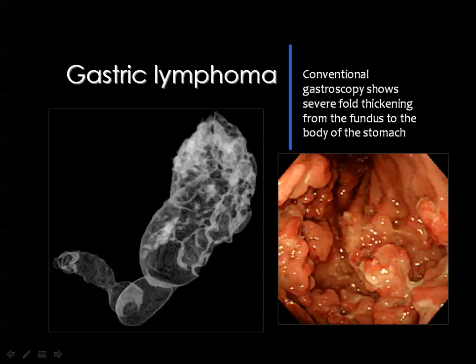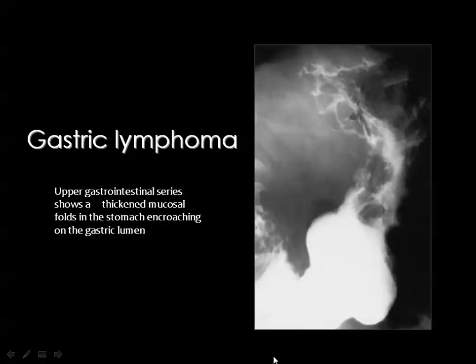And this is a common appearance of lymphoma infiltrating the gastric wall, presenting by bulbous mucosal hypertrophy, and this is CT gastrography, or the reformatted image of the stomach using multi-detector CT, and this is the appearance of the lymphoma by endoscopy.